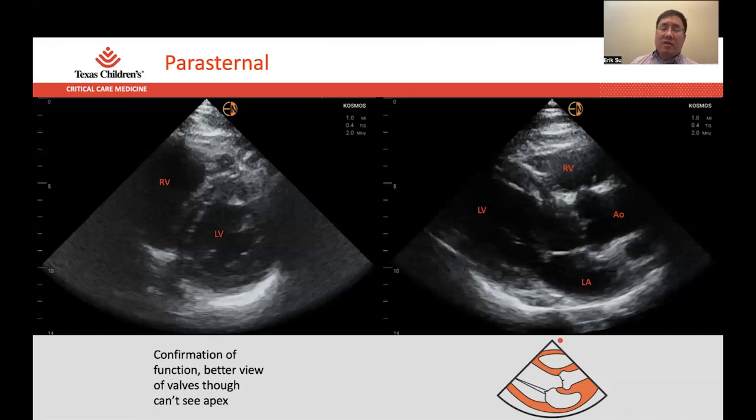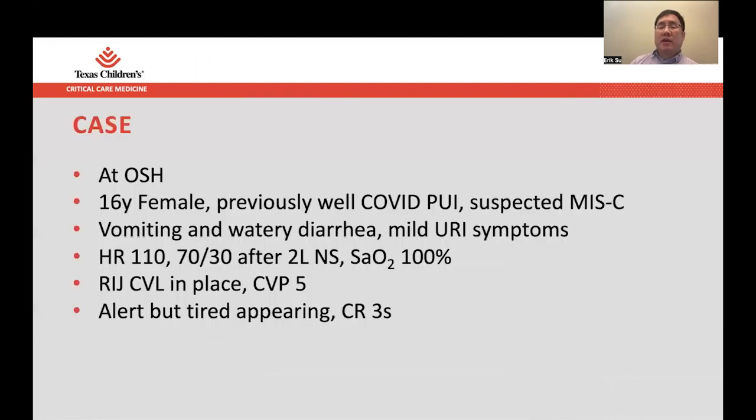And this really gives you a good sense of structure. If you're on ECMO, it can help you, with some modifications of these views, figure out if your cannulas are behaving and so on and so forth. So I just want to start with the case that we talked about in the previous talk that I did, only because it helps provide some context.